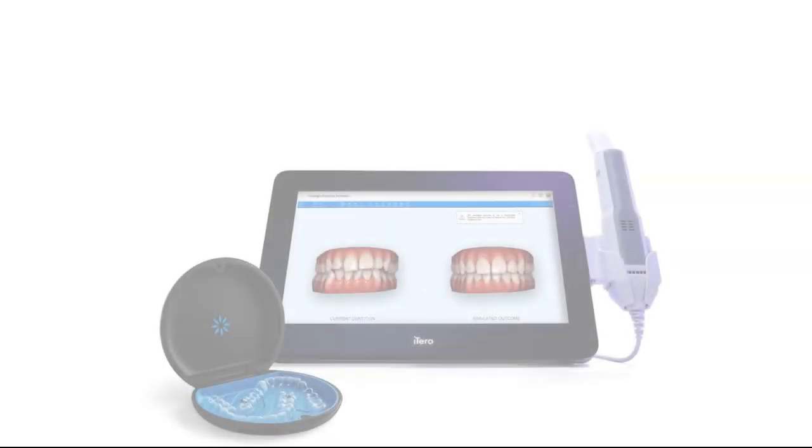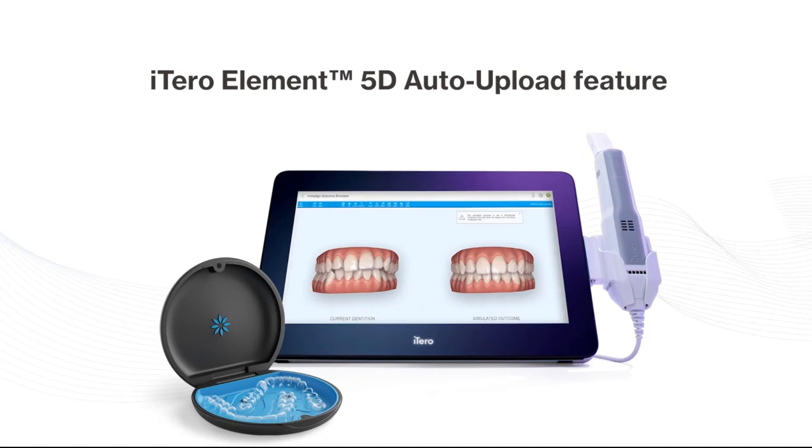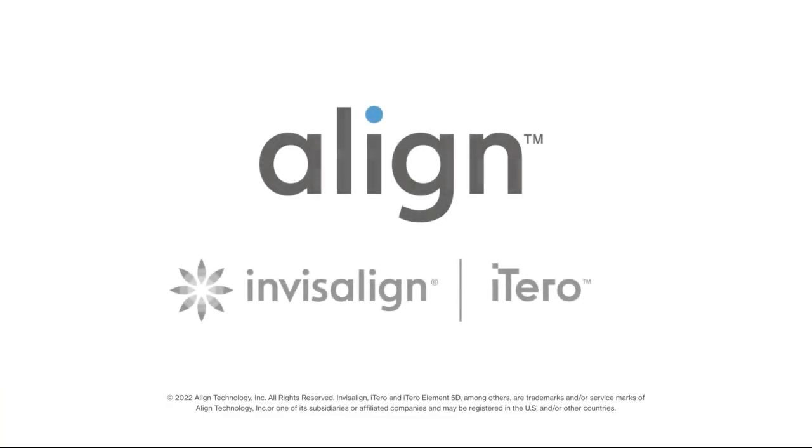This streamlined case submission workflow, enabled by the iTero Element 5D Auto Upload feature, provides valuable time savings. Take your practice to the next level with Invisalign clear aligners and iTero Element 5D imaging systems.